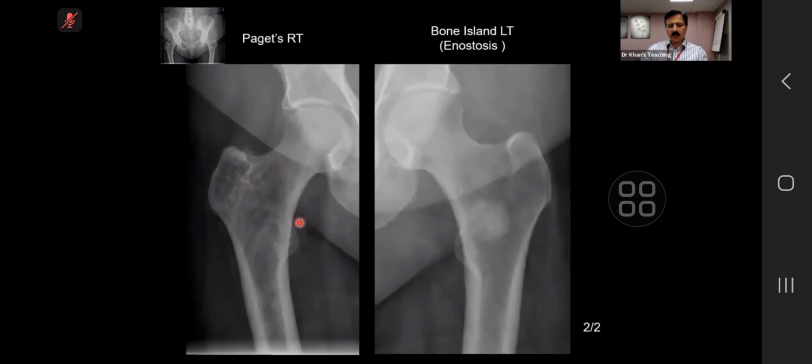And this is what can happen in the exam. There might be two findings on the same case. If you look carefully, look at these trabeculae. So this is early Paget's disease. This is thickened trabeculae and nothing more than that. So you got confused because of this, and that is artifact, so don't worry about that.